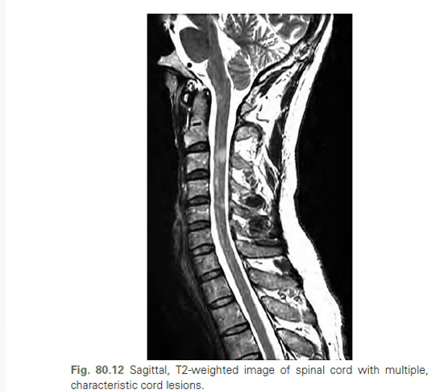Because of this extreme density, even a tiny, innocent-looking T2 hyperintensity like the subtle one visualized here in this image can completely disrupt signal conduction. This explains the classical clinical-radiological mismatch where a patient presents with a profound neurological deficit, like a distinct sensory level or a spastic paraparesis, despite a scan that only shows a few millimeter-sized spots.